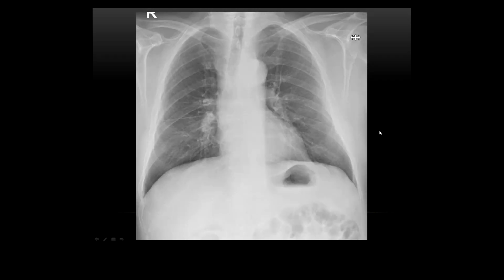Okay, then what do you think of this next one? One more subtle, this one. Yes, there is. It's a good point to look at that because your chest X-ray is nice and central, but it is deviated. But I think in this case, it was actually related to the aortic knuckle. So the ascending aorta is just knocking it onto the side a little bit.